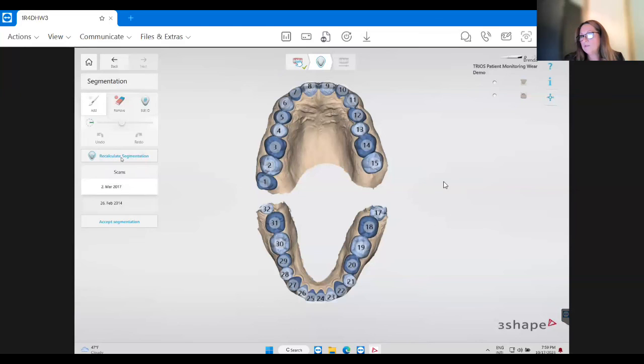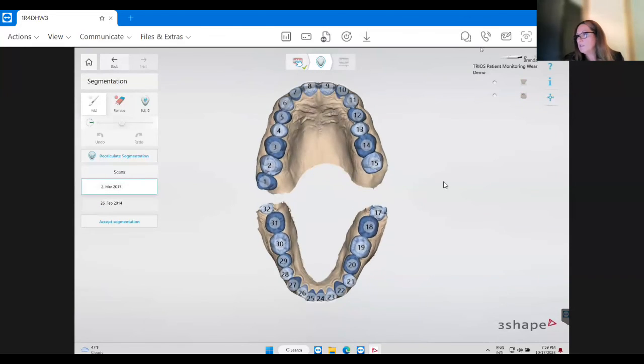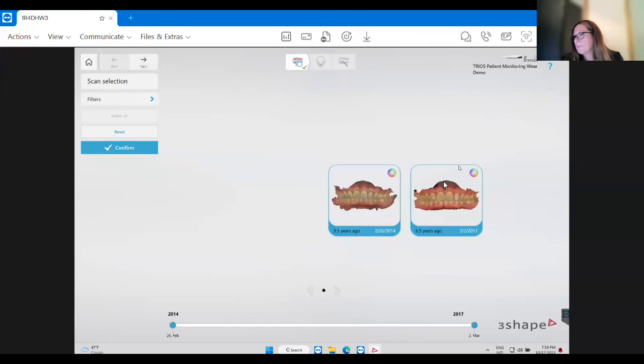Okay. So if you wanted to see from 2014 to 2017, let's go here. Confirm that.